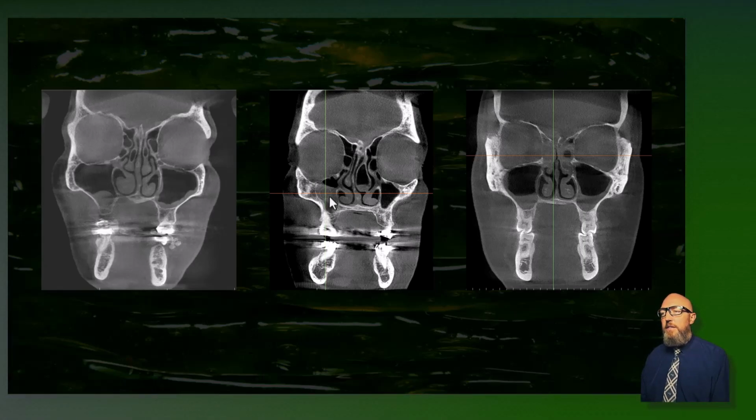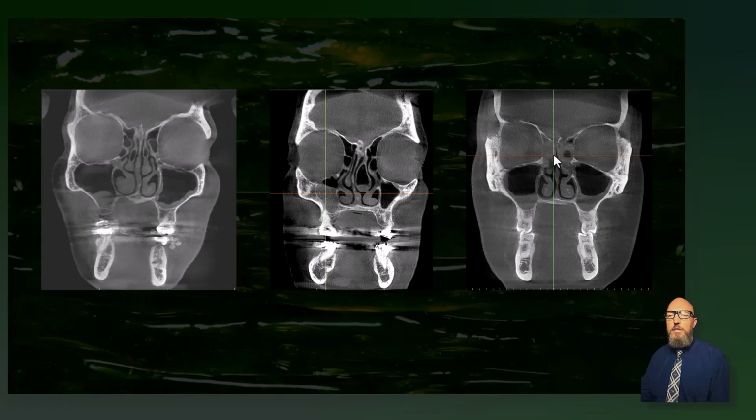And then how is this different? Does it look like just mucositis, or does it look like an air fluid level, an air fluid meniscus? Yeah, this looks like a meniscus, which is a sign that potentially leads us toward acute sinusitis. Also of note, there's a concha bullosa right here. You can read about that if you want. This one shows what's likely air fluid levels in both sinuses, and then look at the ethmoid air cells. The osteomeatal complex is the drainage from the maxillary sinus into the nasal cavity, and that's completely obstructed, and you've got obstruction, opacification of the ethmoid air cells as well.